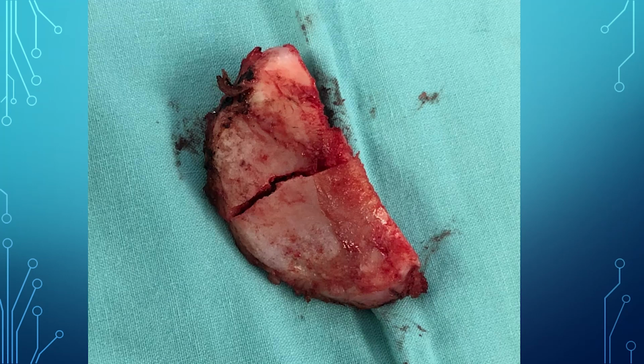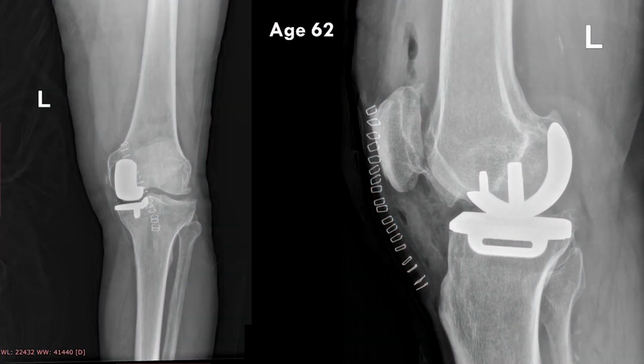In fact, this tibial plateau fractured here because it was very difficult to remove the posterior part, which was thicker, and this is why it fractured. And this is the result. This is a 62-year-old, and exactly the implant used is large femur and tibia D. Those are cementless implants used in this case. I usually use cementless implants.